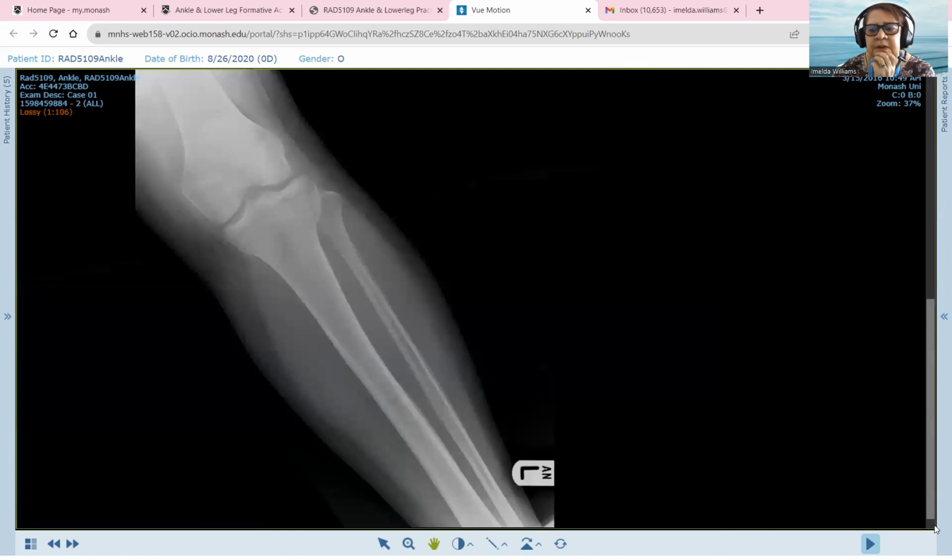We are also able to see that there's a fracture of the bone, so you should tick the bone as well. And then, of course, it involves the knee joint, so cartilage is affected, and the soft tissue has been affected because we saw the lipohemarthrosis. So the main comment that you should have here is that there is a compressed or depressed fracture of the lateral tibial plateau with associated lipohemarthrosis.